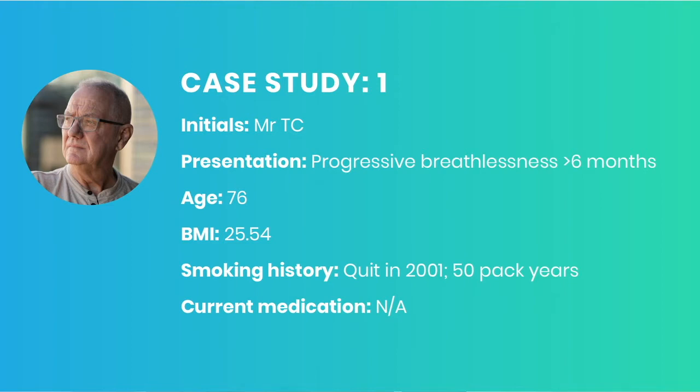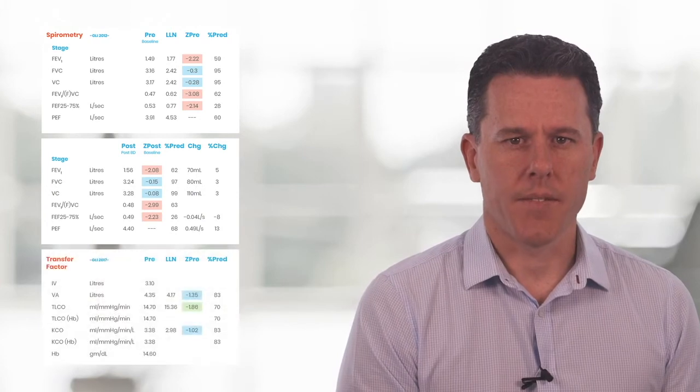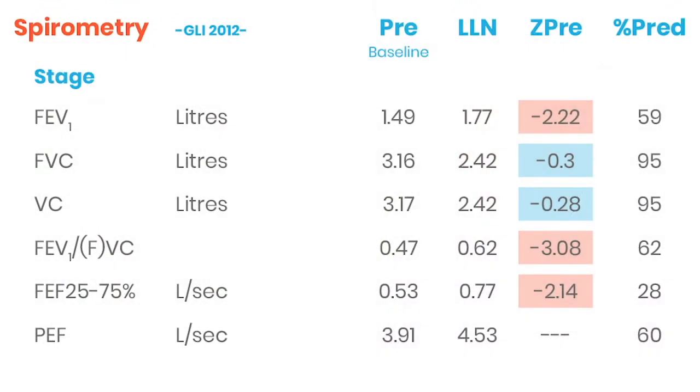And so this is a typical patient presentation where spirometry in the investigation of breathlessness is going to be very useful. So here we have the spirometry values, and we have pre-bronchodilator, post-bronchodilator, and then we have the gas transfer. If we look at the pre-bronchodilator first, the first thing you notice is that, as I explained earlier, the difficulty in interpreting this test is that there are just too many numbers. The numbers are also not in a good order because they're not in the right order by which we should interpret them.